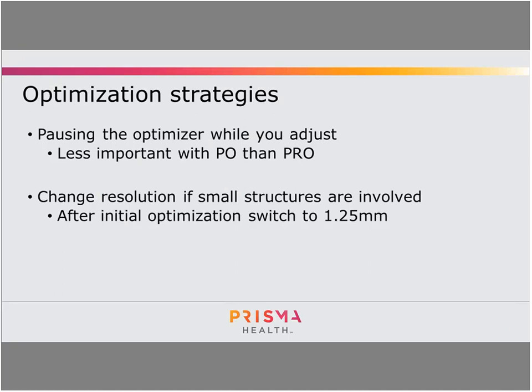And also, in the PO, the resolution is a feature that was different than the PRO. So if you remember in version 11 or before, you could go in and type in different resolutions for structures. But in the PO, what you do here is you can just select a resolution during the optimization.